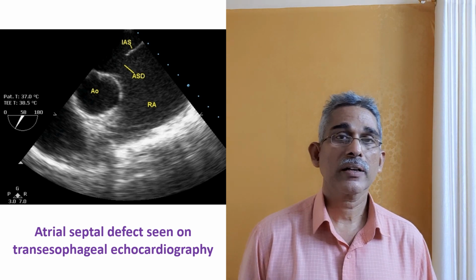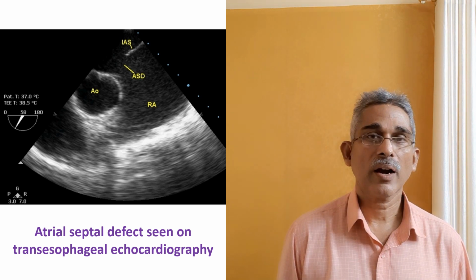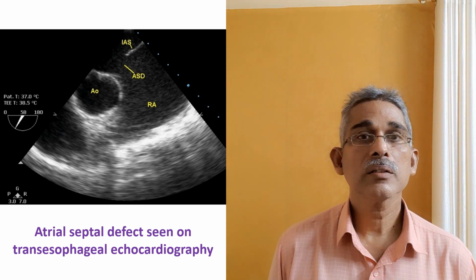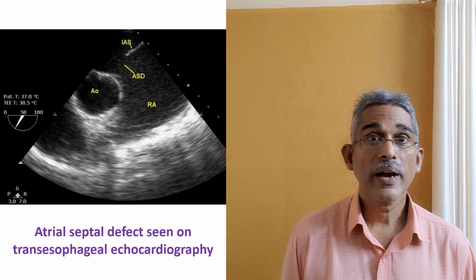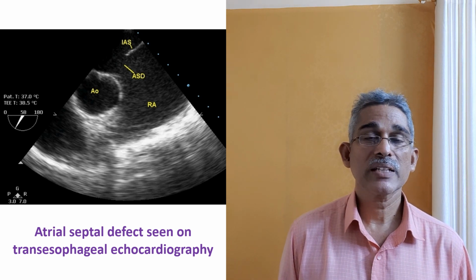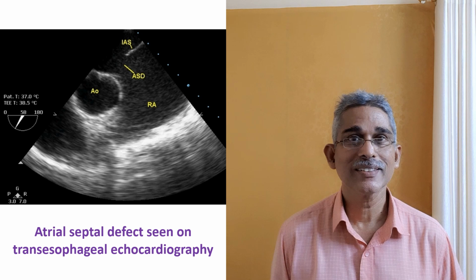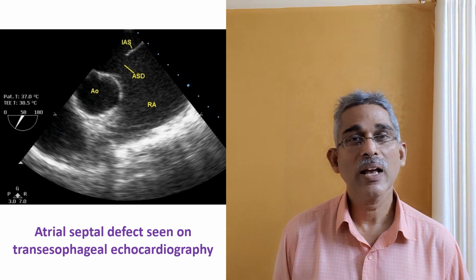resolution imaging. For example, for left atrial appendage clot evaluation, transesophageal echocardiography has an advantage. Then left atrial evaluation behind a prosthetic valve. When you image from above, the left atrial side of the prosthetic valve may not be imaged well because of acoustic shadowing by the metallic components. There are some such advantages for transesophageal echocardiography. Another advantage is that you can have the transesophageal probe during surgery, so that you can monitor the heart during cardiac surgery as well as non-cardiac surgery.